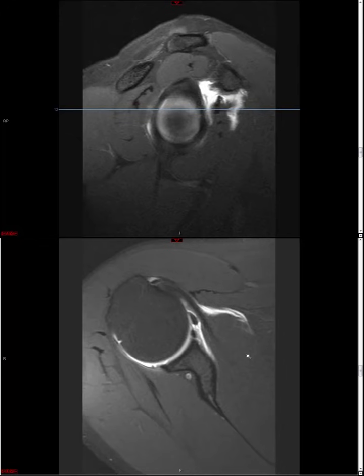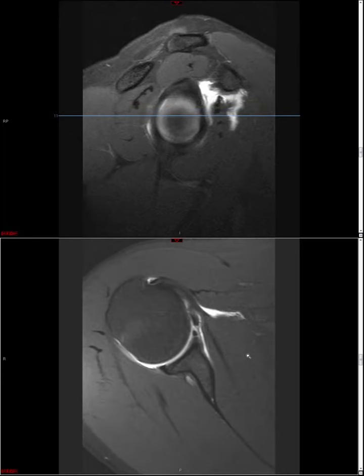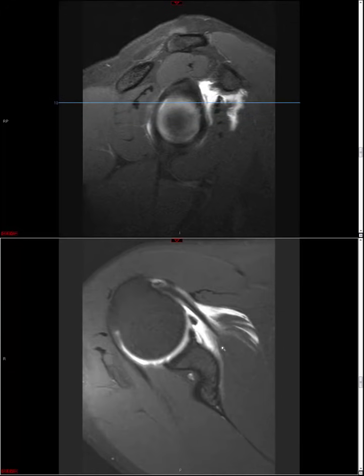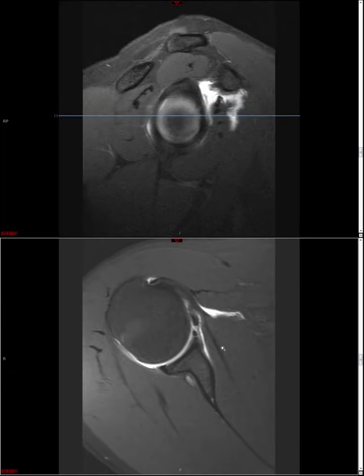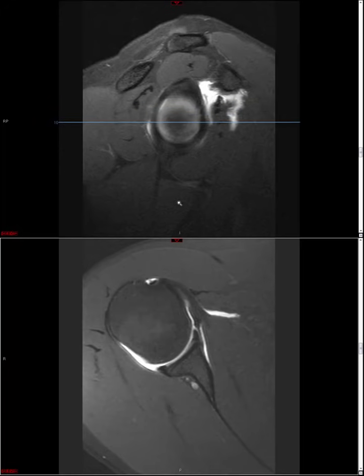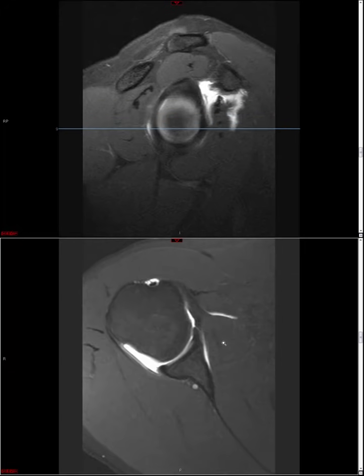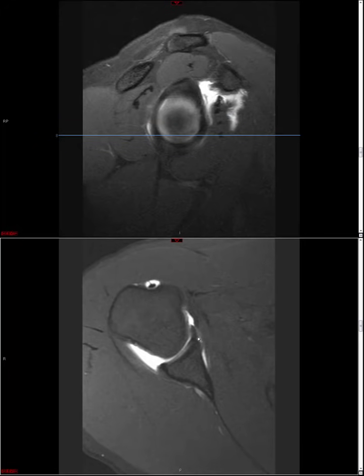then when you scroll down to 3 o'clock, there we go. You see how, from these two images and then at 3 o'clock, magically a normal appearing labrum reappears. So that's essentially the exercise you go through to ensure that you're just dealing with a variant. Cleft, normal labrum. And look at that, we're right at 3 o'clock. All right. If you see a quote-unquote normal variant, but then you're scrolling down to 3 o'clock, 3:30, 4 o'clock, and you still see the quote-unquote variant, it's not a variant, it's a labral tear.